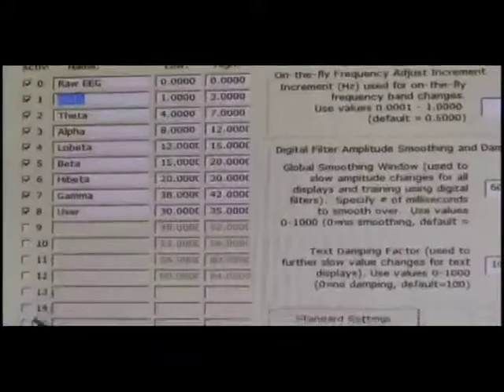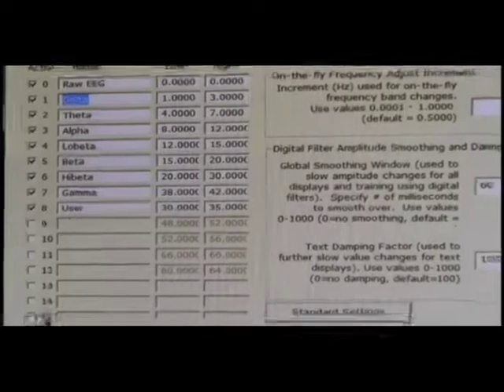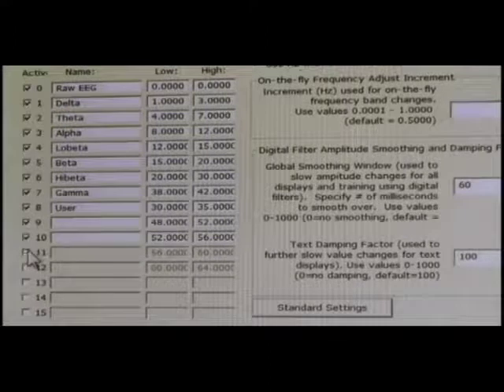It's very important. However, if you're doing traditional neurofeedback and you want to modify a specific component, call it my favorite component, I can change the bandwidths to anything I want, and the frequencies can overlap. You can go down here and add up to 15 different components, so you're not limited to just 8. You see these other ones are available. Just as I start to check them, they become lit up, and then I can take them back off. Okay, so something to keep in mind.